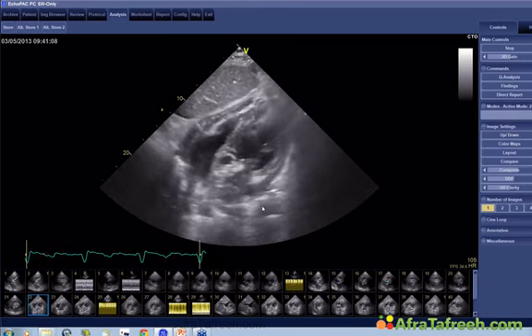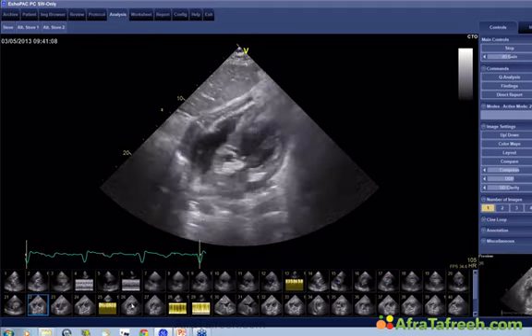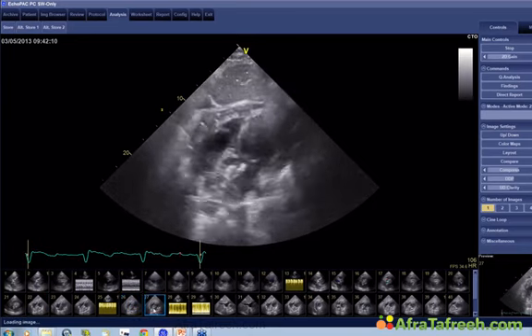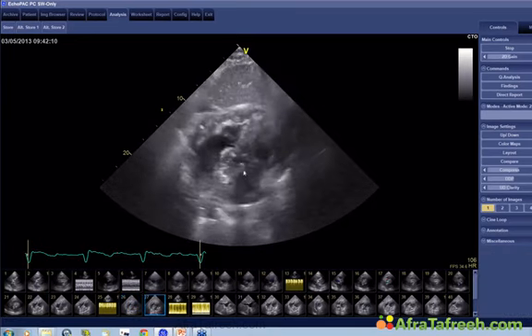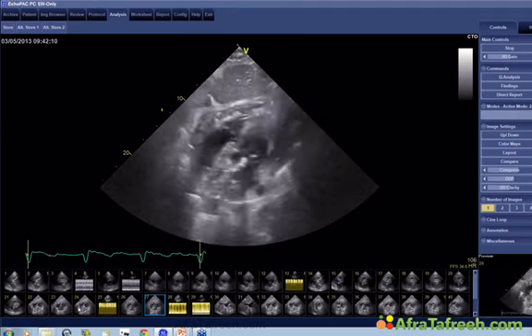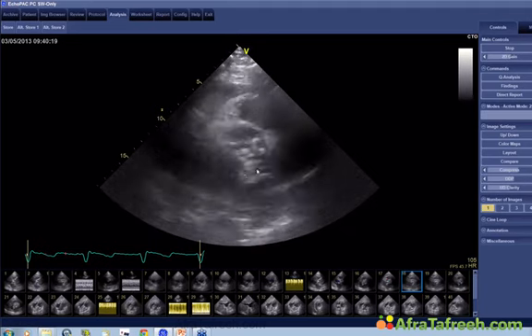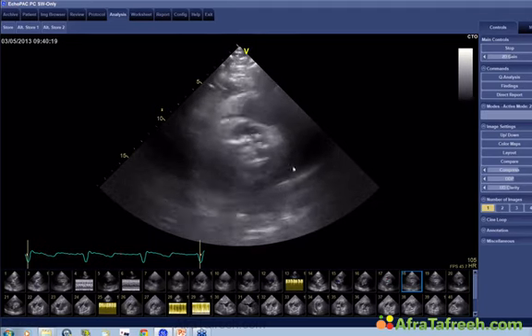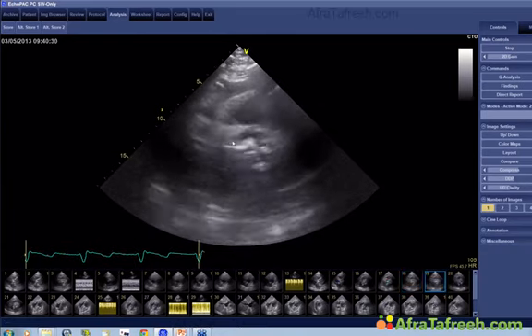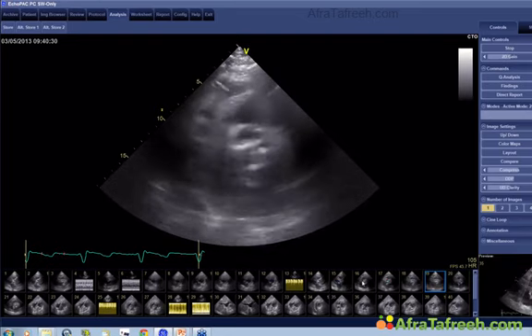Okay, Neha thinks it is endocarditis. Does anybody else think it's endocarditis? Is it only endocarditis? Okay, let me just walk you through this here. Well, this is the aortic valve. The aortic valve is thickened. There is no question. There is a bit of calcification here, and the whole aortic root does not look completely normal. Okay, there are some structures which look very suspicious.